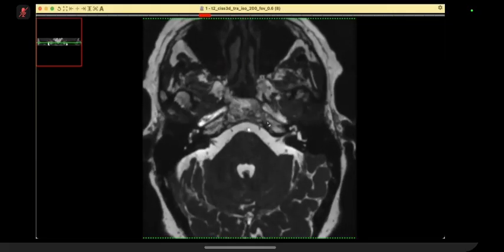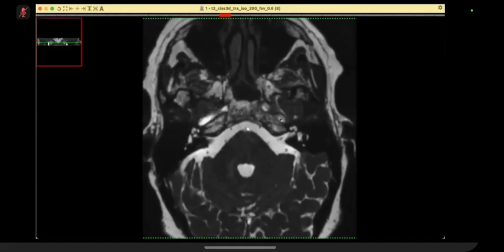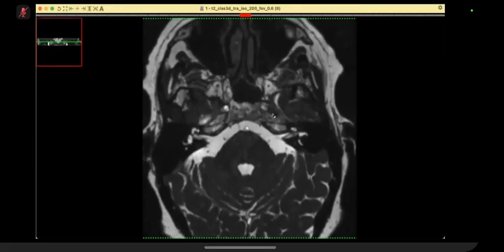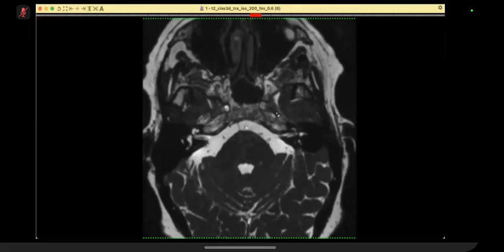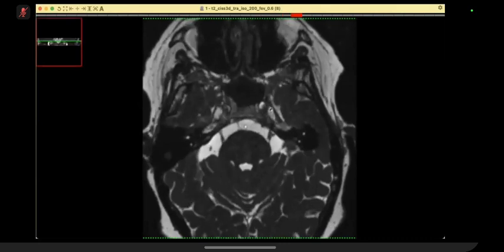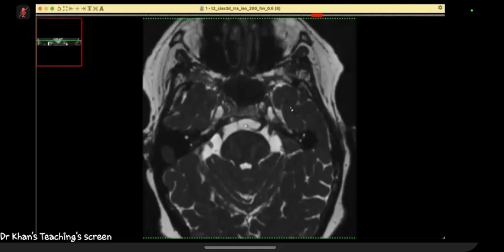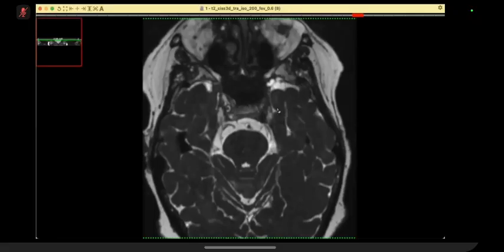I do agree with that. Now, this is the carotid canal, and within the carotid canal, you have got the carotid artery. Here, this is the cavernous portion. And cavernous portion of internal carotid artery is an exam favorite because they will show you cases in which it is blocked. So always it should be part of your protocol to look into this.